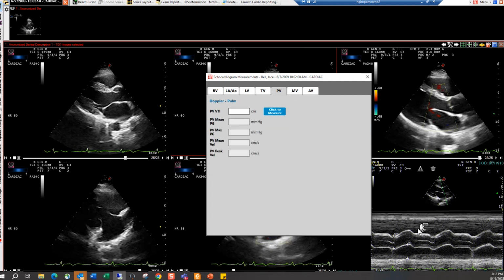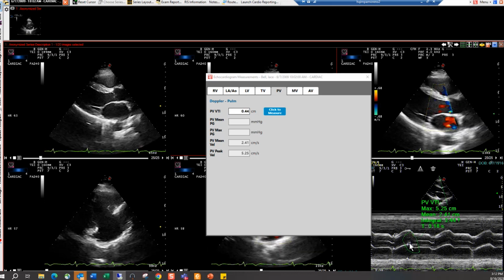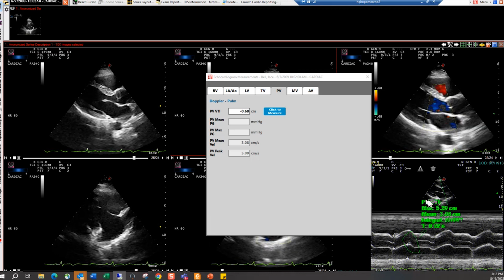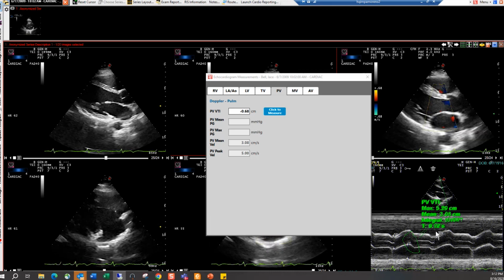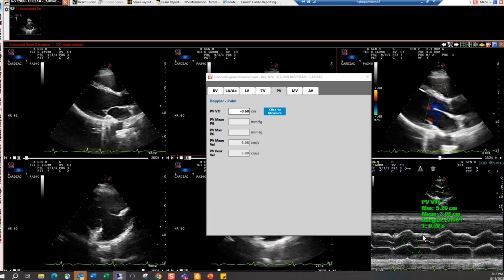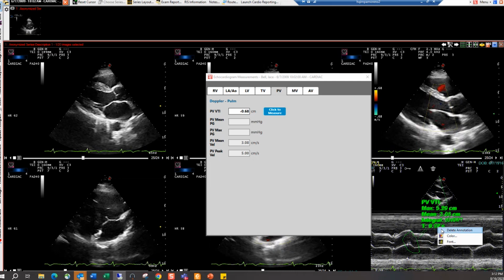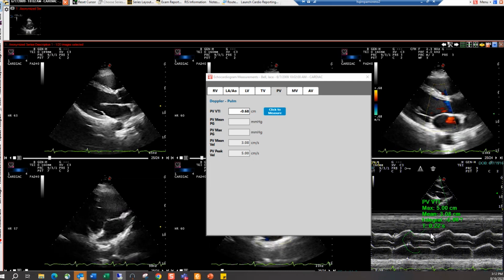If you click on here, and I'm probably not measuring the right thing, you can see that it remeasures. And I did that twice, so that's why it looks like it's superimposed, because it is. If I can remove one. There we go, just down to one.